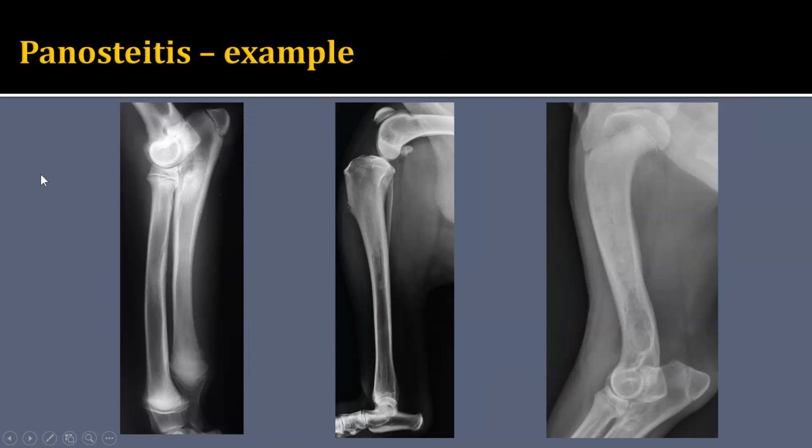These are 3 different patients with various manifestations. On the left is a more early manifestation, and there's this well-circumscribed area of nodular medullary sclerosis in the proximal ulna, probably a small amount here in the mid-radius. Again, notice that is near the nutrient foramen.